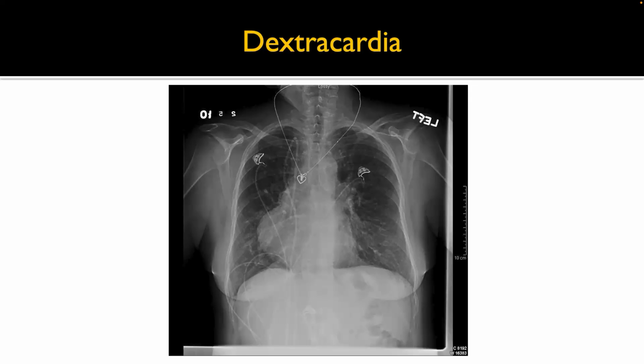Our last part of the slideshow, just to throw something different: dextrocardia. Basically the heart, or you'll have situs inversus, where all the organs are flipped left and right. For dextrocardia, the heart is on the right-hand side versus the left. And you can tell, on the chest X-ray, they documented it as a left. Different perspectives, just food for thought from that standpoint.